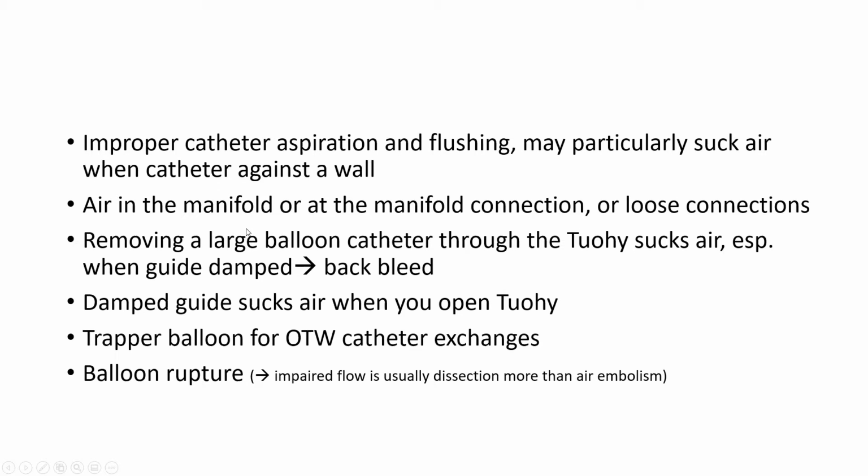But this happens more often, although still very uncommonly, in interventions. And this is the most common situation. You're removing a large balloon catheter through the Y hub, which can suck air, especially when the guide pressure is damped. That's why it's so important, when you're removing a large balloon or a large device from your guide, to let it back bleed vigorously after you take your device out so you don't suck air. A damped guide sucks air when you open the Y. Another thing is a trapper balloon we use for over-the-wire catheter exchange. When you deflate it, it sucks air.